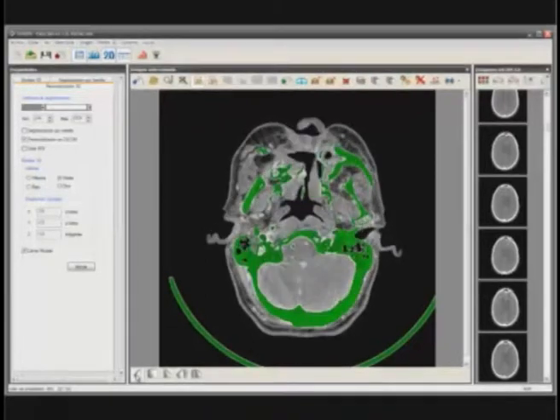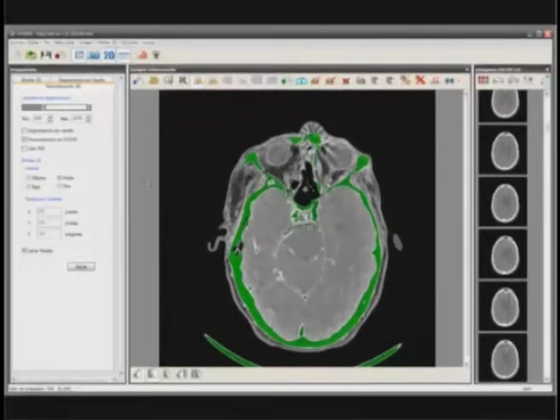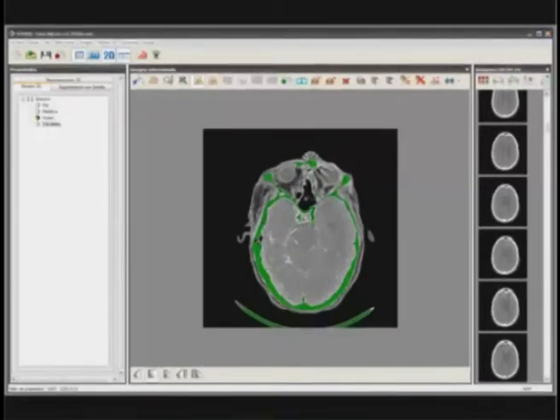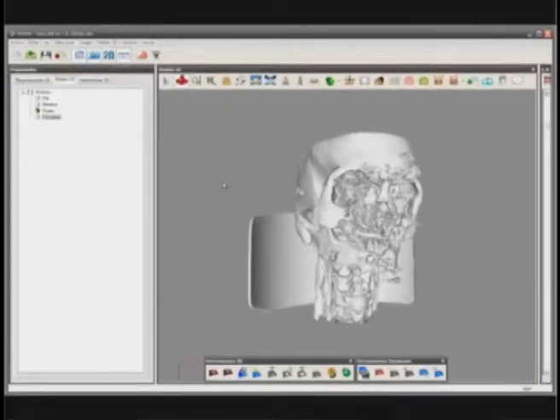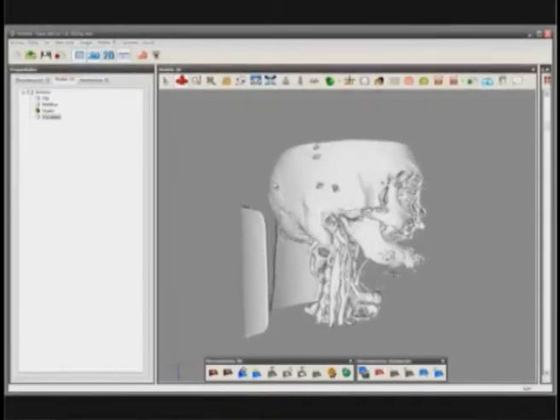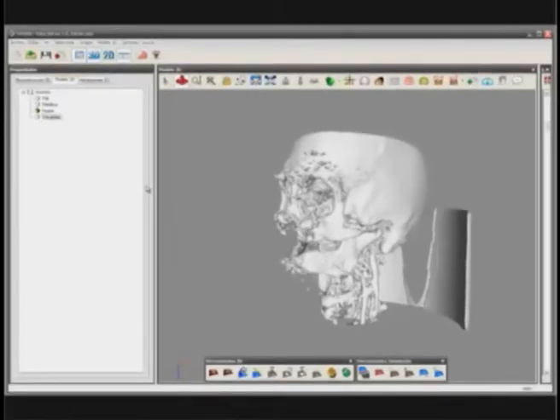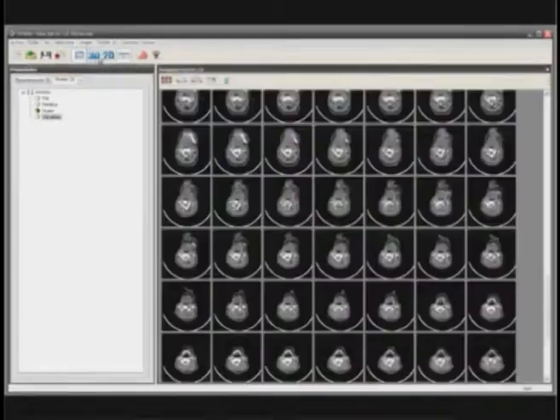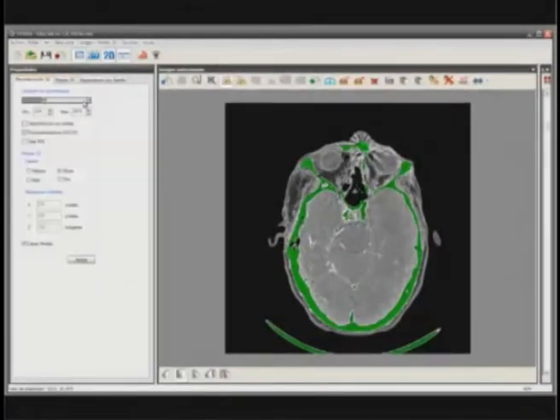After selecting a cut, we can see that the program applies the green color to all the pixels with the same characteristics in all the remaining multiple cuts. Here you can see AYRA's capacity to display what we just selected in a virtual way, entering parameters such as the perspective and, as we will show later, the textures. This is a tridimensional representation of all the multiple pixels that we had identified in green color according to their density.